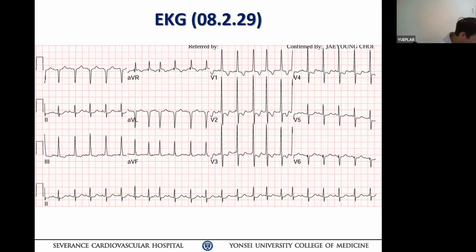If it's a pediatric patient, I would go more with JET, based on the ECG. Because there's AV dissociation, JET becomes likely. For AT, there should still be some 3:2 or some form of AV conduction, but I cannot see a pattern here.